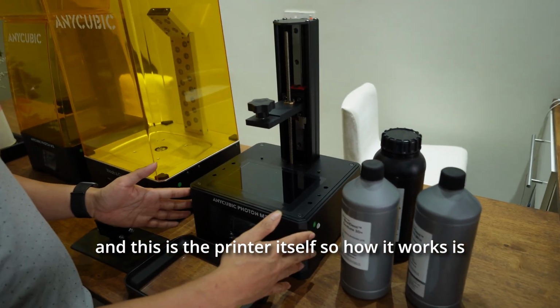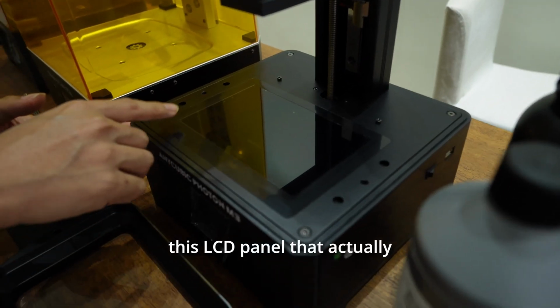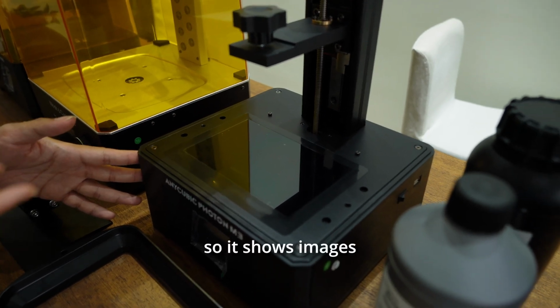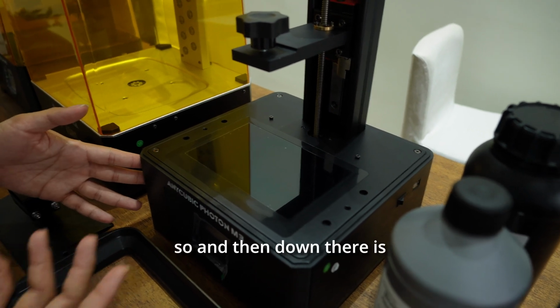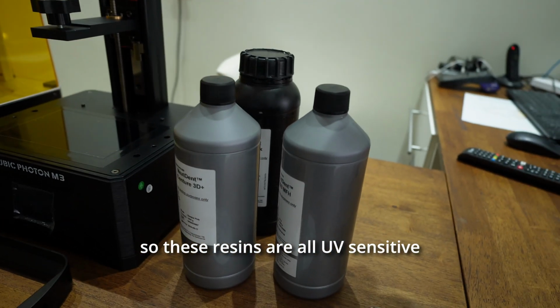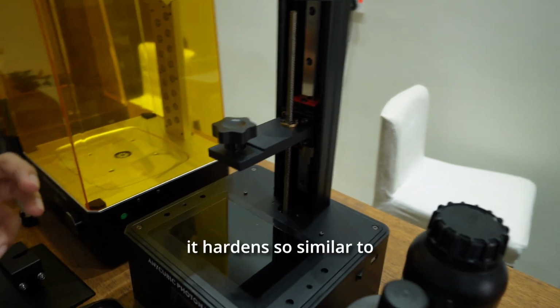So how it works is, this is actually an LCD panel that literally shows slices of the 3D model. It shows images one by one, literally hundreds of images. Down there, there's a UV light source. These resins are all UV sensitive, so when enough UV light hits them, it hardens.